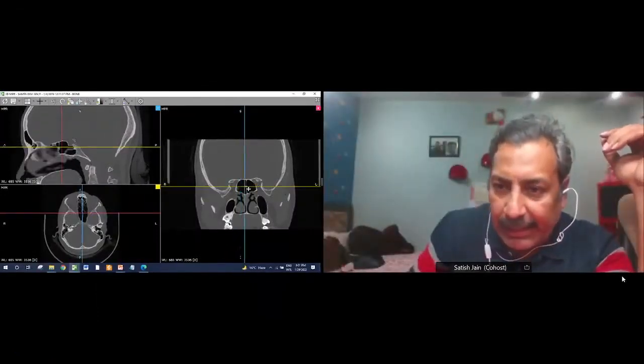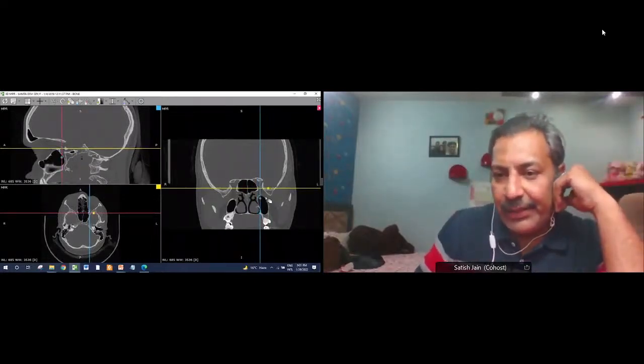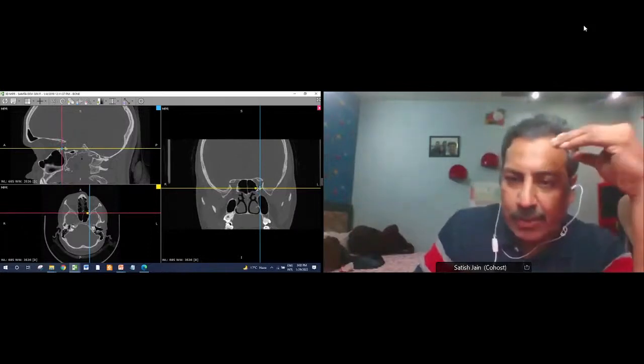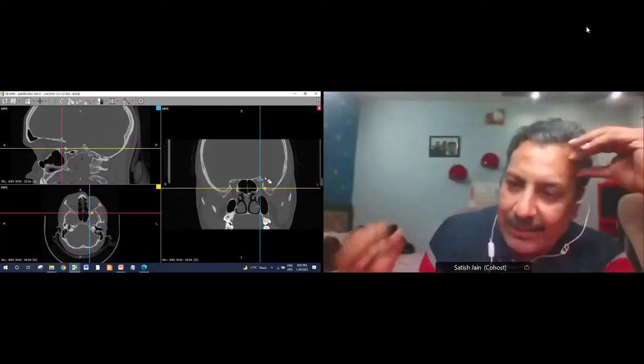Now, my area for the superior orbital fissure is here. This is the inferior orbital fissure. This is the superior orbital fissure. And above that is the optic nerve, see the optic nerve coming. So this superior orbital fissure is separated from the optic nerve by the optic strut.